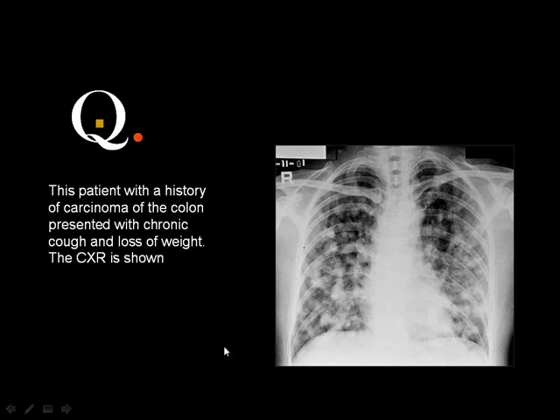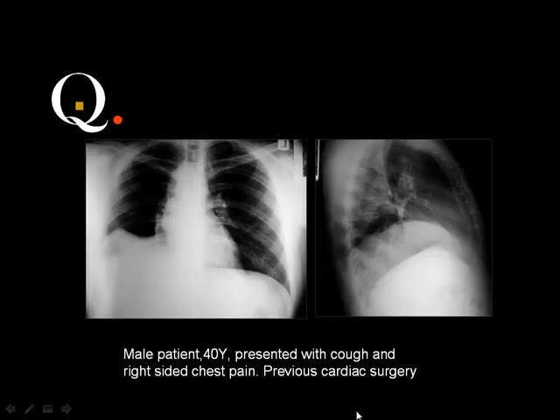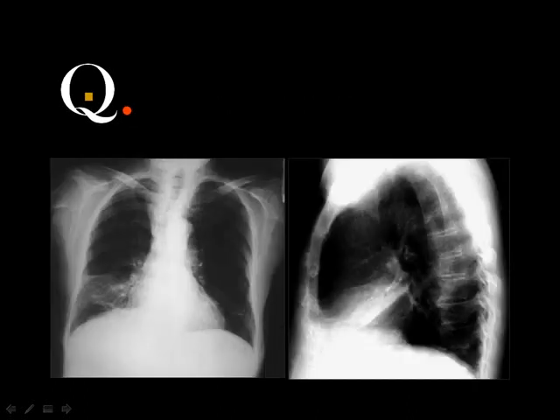Nodules, many nodules, and a patient with carcinoma of the colon, then you know that these are metastatic deposits. Okay. Very good. Elevation of the diaphragm with shifting of the apex of the diaphragm laterally, then you are dealing with subpulmonary effusion. Nodule, mass, patch, cavity: patch. The diagnosis without history is pneumonia. Okay.